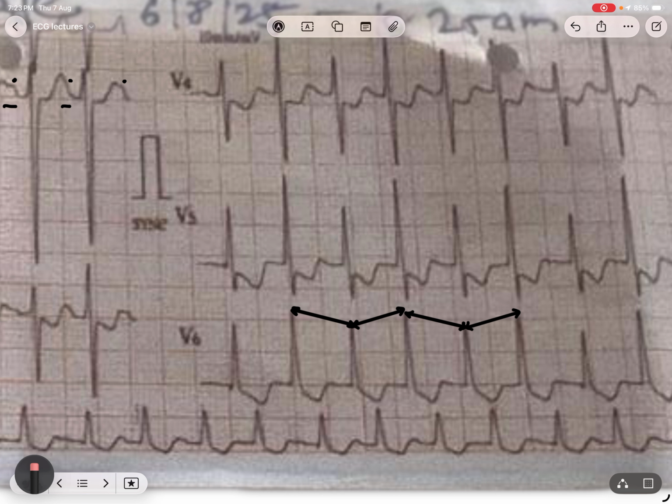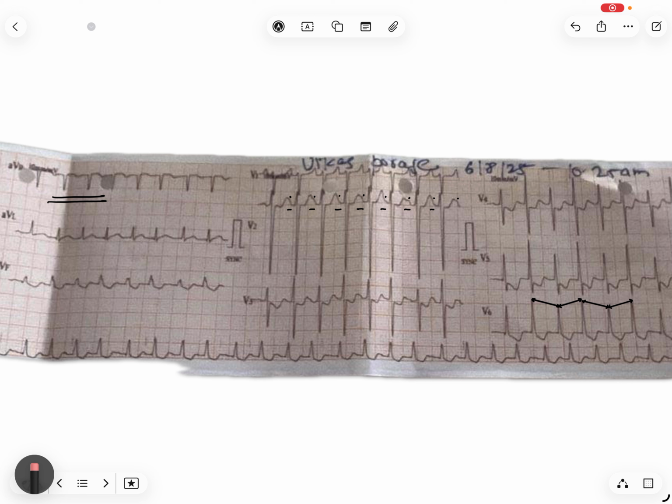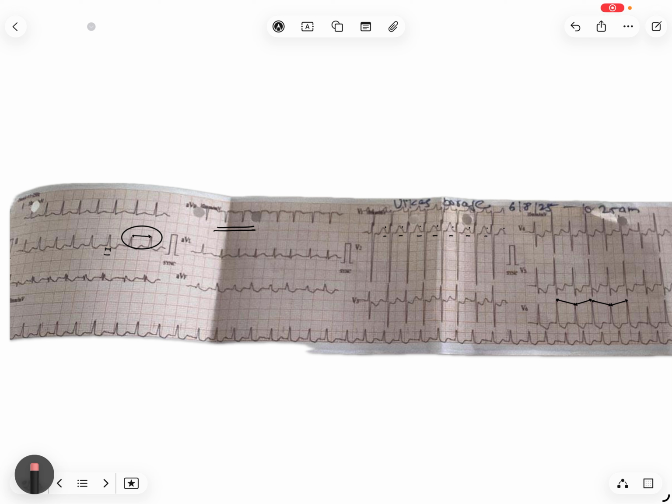Other than this, there are a few things that we can see in the ECG that you might be confused about. One is the ST depression. What is the cause for the ST depression is something that is generally confusing for many people. So, one thing about the ST depression is that it is downsloping with T-wave inversions, which are asymmetrical. This is generally related to some kind of stressor on the LV myocardium, especially when the ST depression is present in V4, V5, V6 and so on.